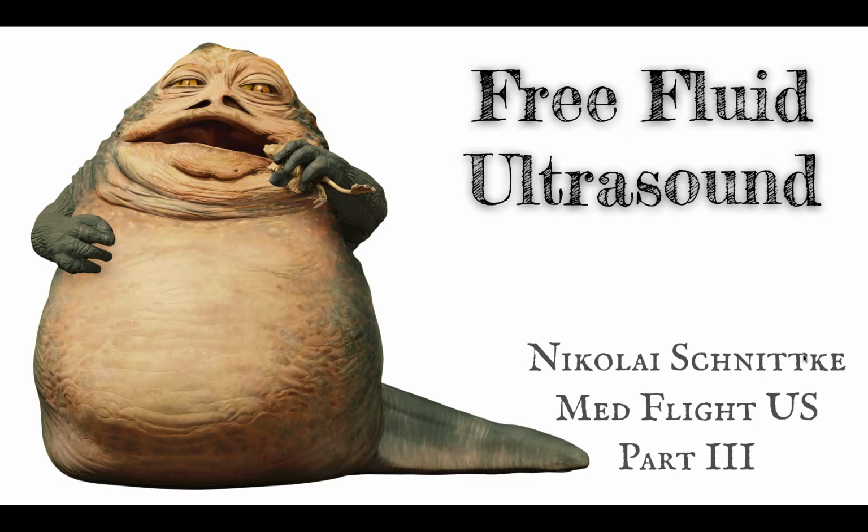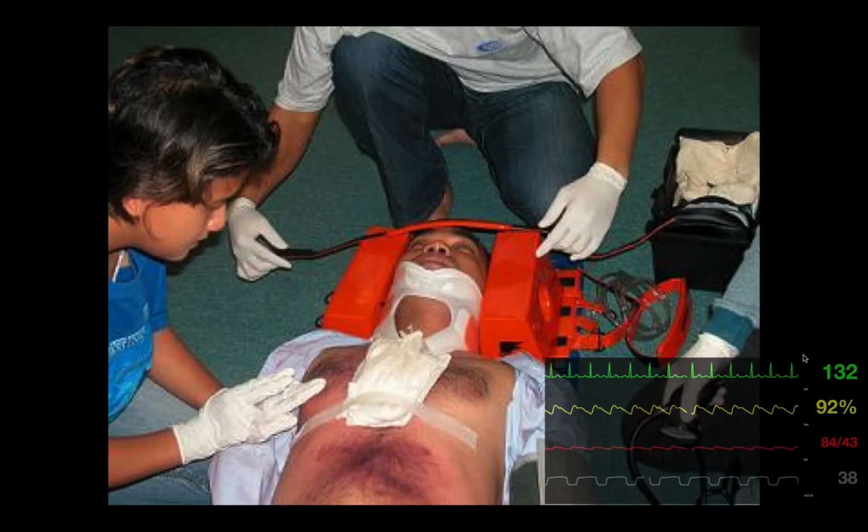Today we're finally going to get down to business and talk about finding free fluid in the abdomen and thorax. This is traditionally what people think of as the FAST exam, looking for blood in the abdomen of trauma patients. However, the concepts we're going to talk about here today apply to any sources of free fluid in the abdomen or thorax, including ascites, ruptured ectopic pregnancies, pleural effusions, and empyemas.